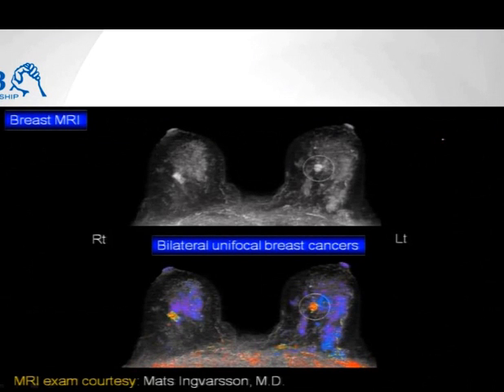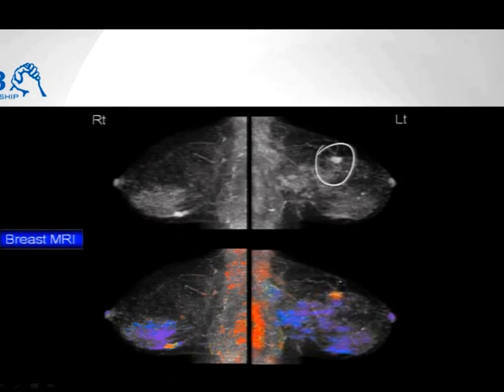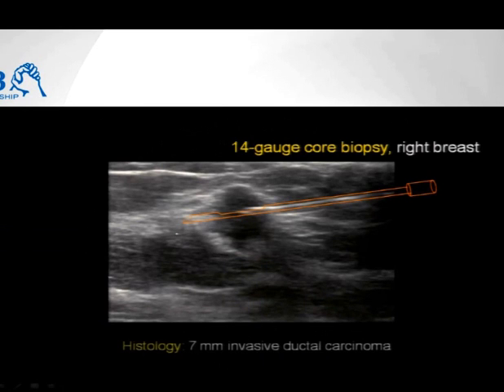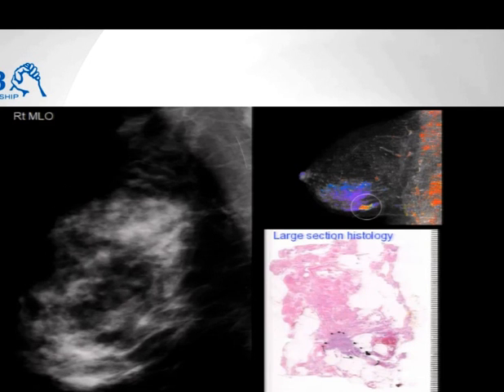And then, of course, the confirmation comes from the MR, which shows the cancer everybody could find, but the other cancer in this 49-year-old woman, everybody is missing. And so this is going to be the future tool that is in women with dense breast. We don't need whole breast ultrasound, please. We just need ultrasound in the dense portion, and that is going to lead to detection of more cases.